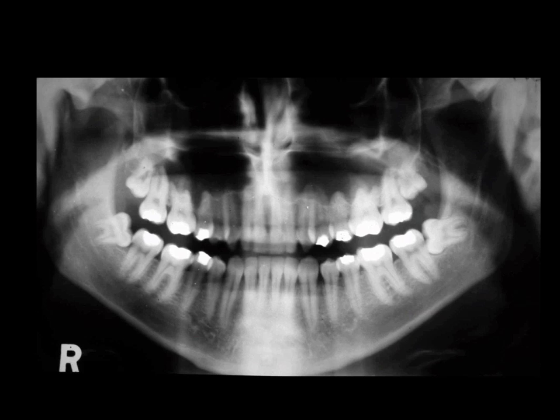This radiograph, a panoramic radiograph, shows a normal variation in the size of the maxillary sinus. You will see that the maxillary sinuses on both sides are extremely large, with pneumatization down in between the roots of the teeth, and the anterior extent of the maxillary sinus, certainly on the patient's left, reaches the midline. This is not common, but is a normal variant, so it is conceivably possible to expose the maxillary sinus and cause an oroantral fistula by extraction of a central incisor.